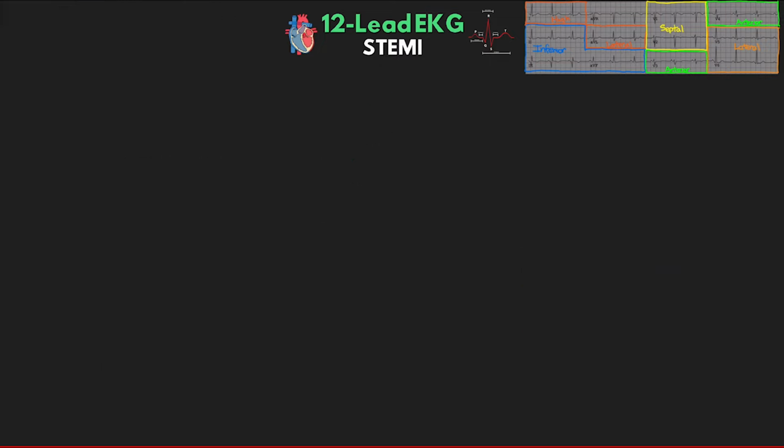All right, now let's talk about the lateral wall. So here we would see our ST elevation in 1 and AVL being our high lateral, as well as V5 and V6 being our lateral or apical. So the left circumflex feeds the high lateral, and for the lateral apical region, this can be any of the three, so LAD, circumflex, or RCA.